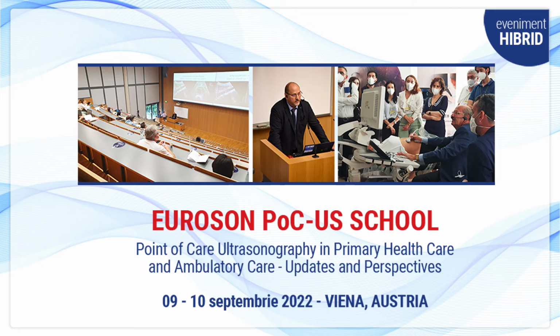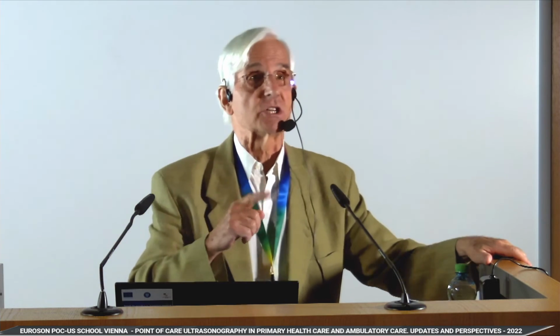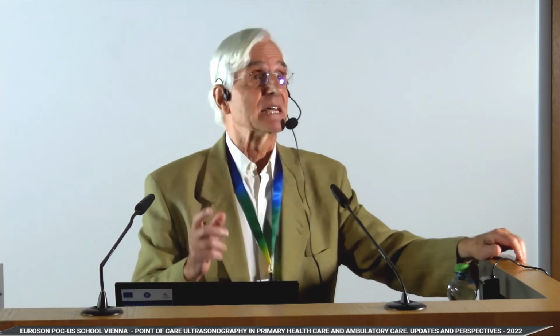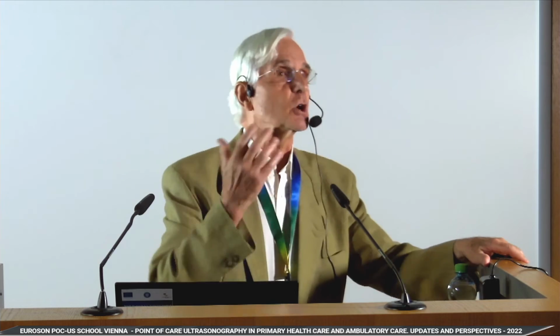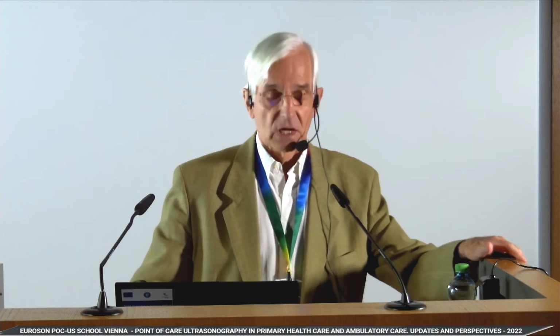And I decided to select not the best pictures I have. I selected some pictures from 8 or 10 years ago because anatomy and physiology are not imaging dependent, but physiology and anatomy dependent. So I am going to now try to develop elastography. Many people think that elastography is a joke, just to try to see benign or malignant, but no, you will see that elastography is something very interesting, and you have a lot of information going through elastography.